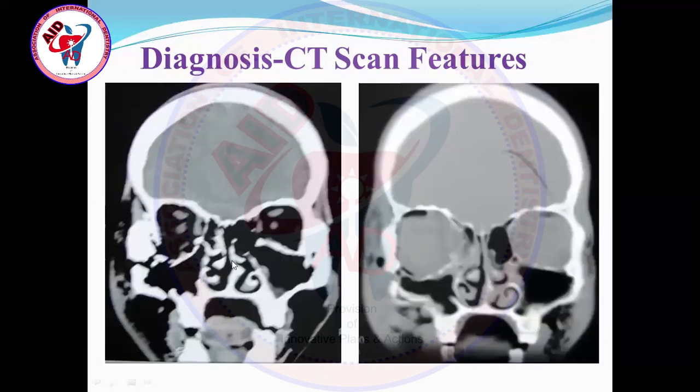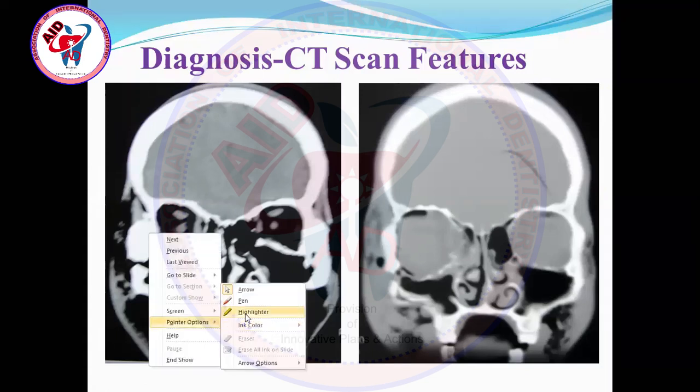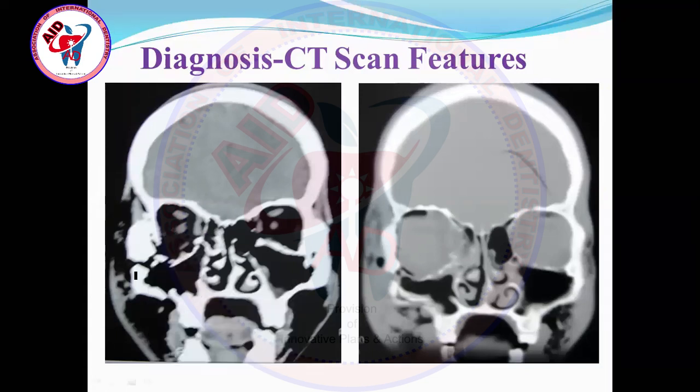Okay, this is a coronal view, and I have clearly described the coronal view. I will now describe the fractured areas on these views. On the right side of this patient, there is damage to the anterolateral wall of the maxillary sinus. Where I'm moving this yellow cursor, there is damage to the body of the zygomatic bone and its lateral aspect, and also the orbital floor.